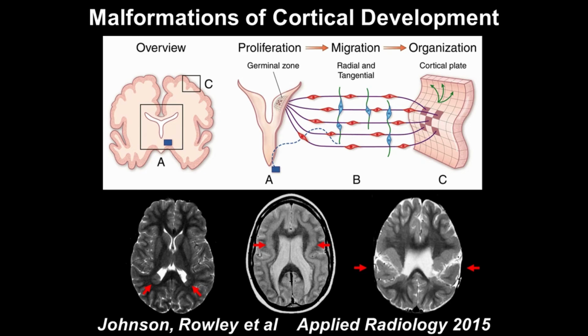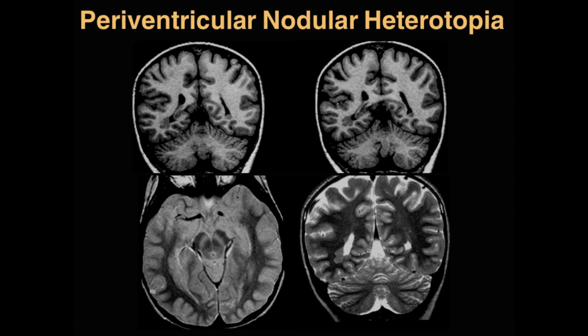That leads to polymicrogyria. As you see here, this is a patient with schizencephaly, open lip schizencephalies bilaterally, and this lumpy, bumpy cortex at the inner surface is polymicrogyric cortex, and this is inherently epileptogenic. So knowing that embryology helps us gestalt, look at our imaging findings in a different light, and helps our search pattern to look for these sometimes subtle abnormalities.